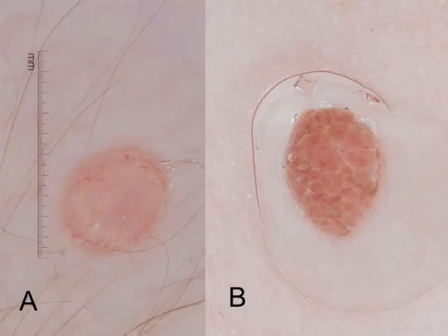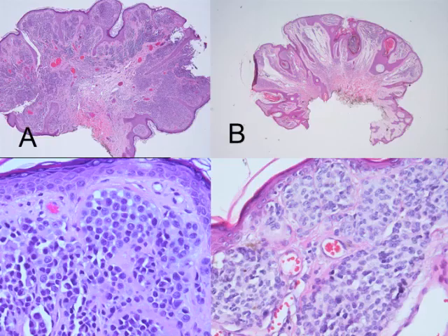Since both lesions are raised, short-term monitoring is not an option for following these lesions. Both lesions require a biopsy based on the fact that they are raised and based on the fact that they reveal a melanoma-specific structure. Lesion A proved to be a melanoma, and lesion B proved to be an intradermal nevus.